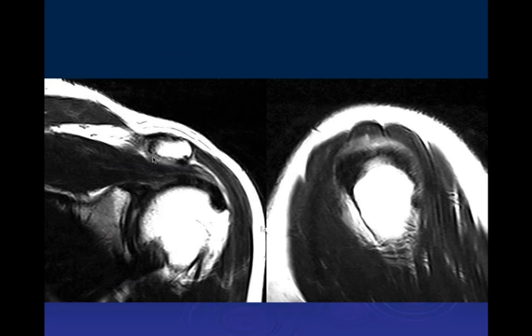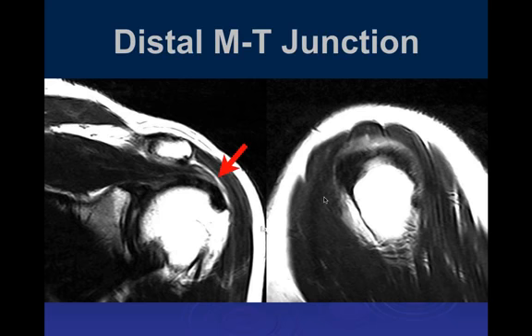And here we can see the acromion process, some increased signal intensity along the superior surface of the supraspinatus tendon distally in that location. And now what we're seeing here is something else that I think can cause increased risk for symptoms of impingement. In this particular case, the acromion isn't really all that abnormal. Well, we're a little bit posterior to the articulation with the clavicle in this location.